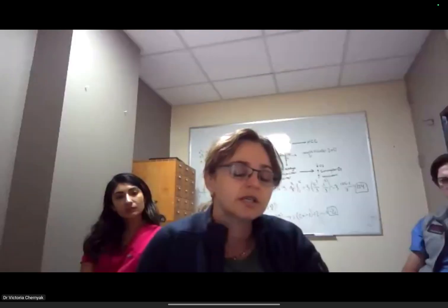And then the other question was about photon counting. There are discussions about spectral CT and photon counting CT. The issues relate to, one, the use of virtual non-contrast. Do you even need the non-contrast, I guess, is part of the question. And two, you're going to lower your kV, and you're going to see a lot more arterial lesions. If it's going to increase conspicuity, does that make it more confusing? How do we apply LI-RADS in those situations? Do we do anything differently?